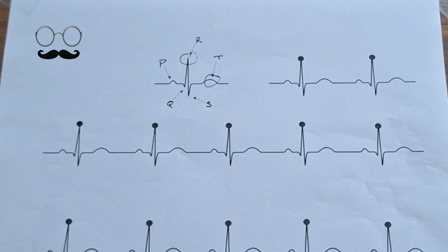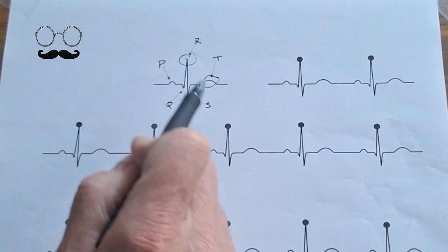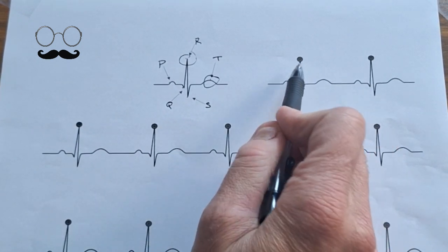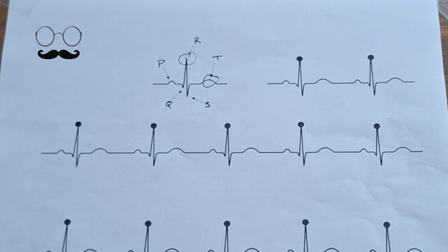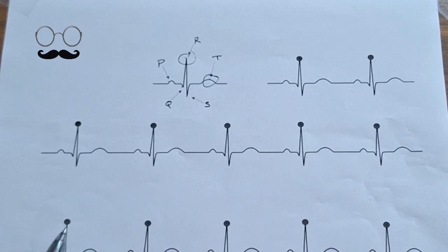For today, we just want to understand that we have our P wave, Q wave, there's our R, S, and T. Now, notice I've put these little tags on here just like your CT scanner were to be tagging. This would ultimately be how you want your scanner to look. You always want your tags to be tagging on the R wave.